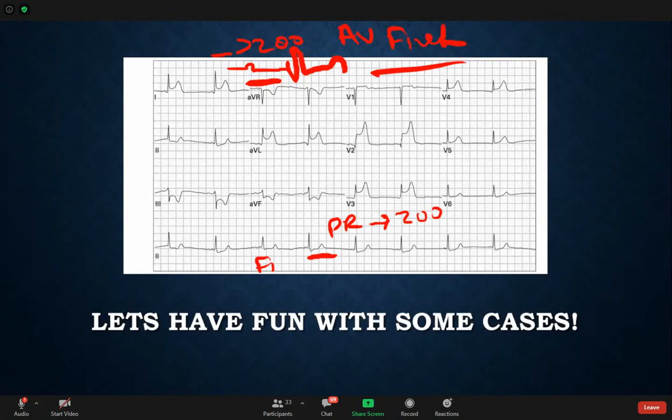Okay, if you understand, we already explained that he has sinus bradycardia, right? And if there's a long pause, it's because you're bradycardic. Your heart is contracting at 50, you have 50 contractions per minute, so there's going to be time between your T wave and your next P wave. But that's your rate.